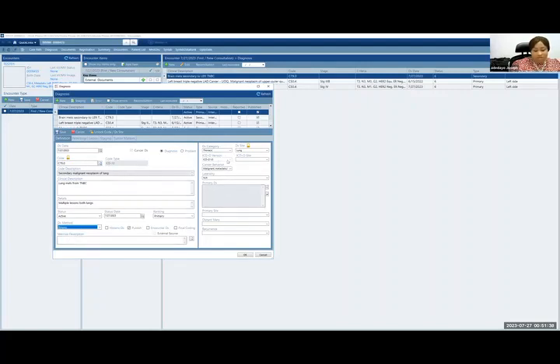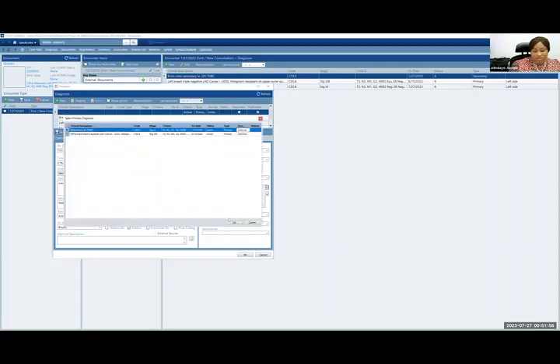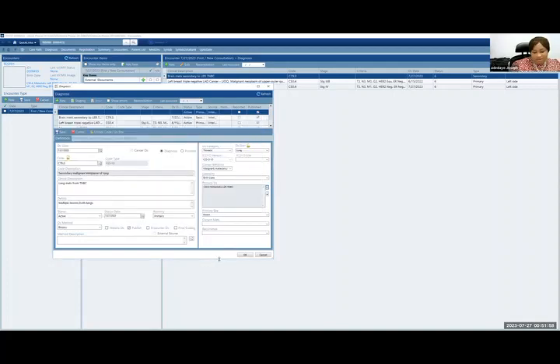What I want to show over here is that when you come to this other side, laterality, if she has just a lesion in the left lung, you can select, or right lung, you can select, or both lungs, you should include bilateral because the lungs are paired. So it's important to fill in laterality for this one. And then again, attach it to the primary diagnosis, which is the left breast cancer. And then the primary site is the breast, as we've said. Distant metastasis, yes. Is this a recurrence? No. And select OK.